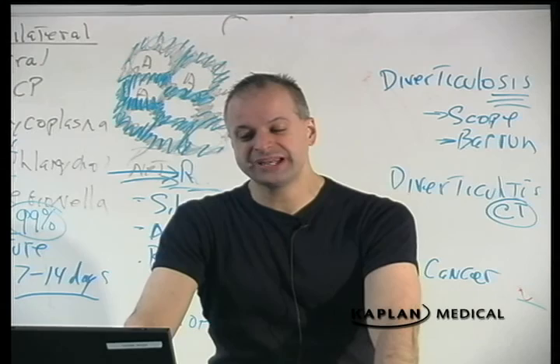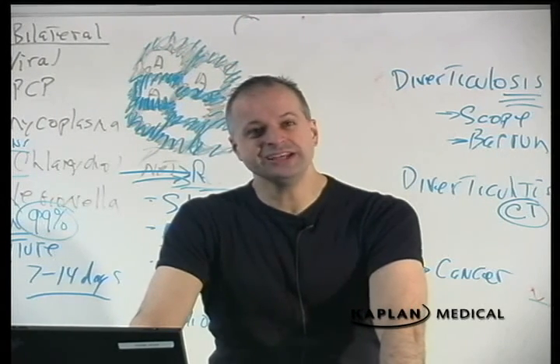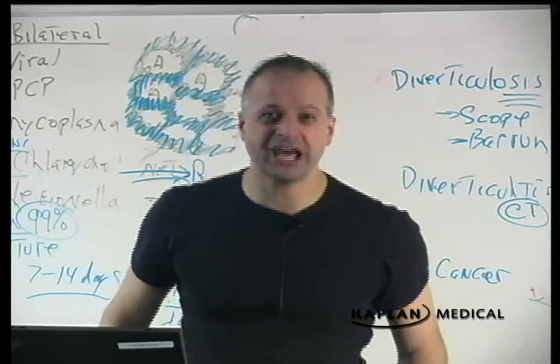Normal, not normal. Oh, look at all this ratty, eaten up damage up and down the whole thing. What's that? It's not cancer. Cancer doesn't happen all the way from the top to the bottom, and you have 18 inches of cancer in the esophagus. No, cancer happens as a circumferential lesion, usually like the colon cancer, spreads out locally. It's not going to go up and down the entire esophagus. This is esophagitis, and this shows you why the radiologic test is never the most accurate test.